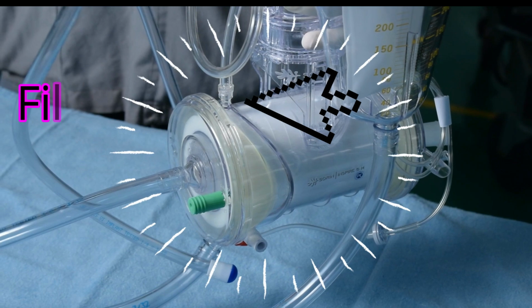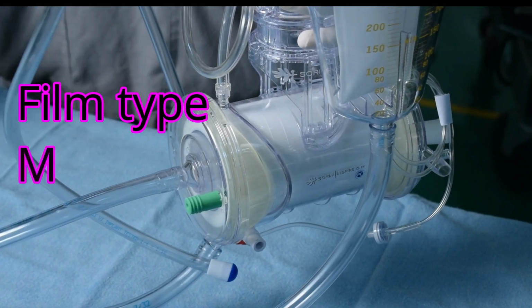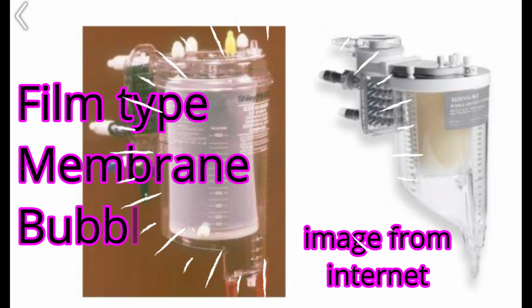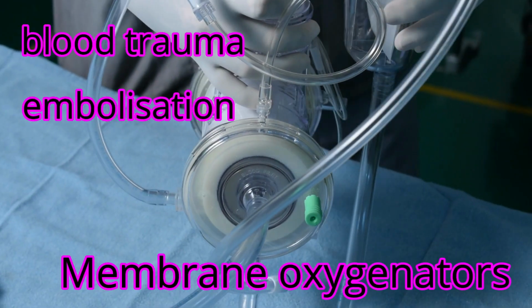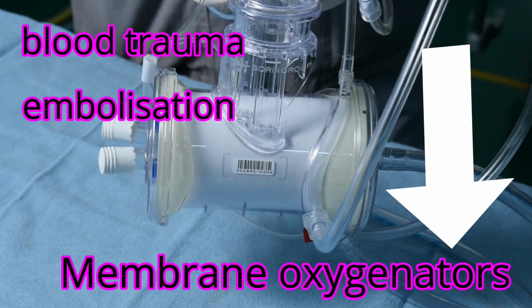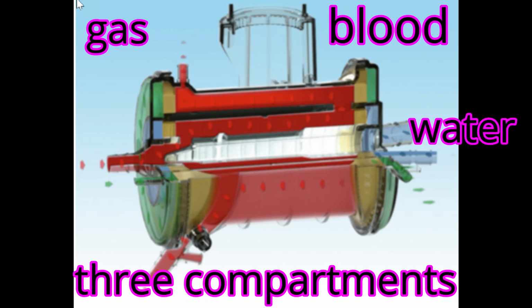Now there are three types of oxygenators known. The first is the film type, or the original Gibbon type of oxygenator. The second is the membrane oxygenator, which is quite common in the current era, and the third is the bubble oxygenator. The membrane oxygenators are the most commonly used ones in the current era because of their advantage over the bubble oxygenators for reducing blood trauma and the risk of embolization. They have three compartments, each for blood, gas and water.